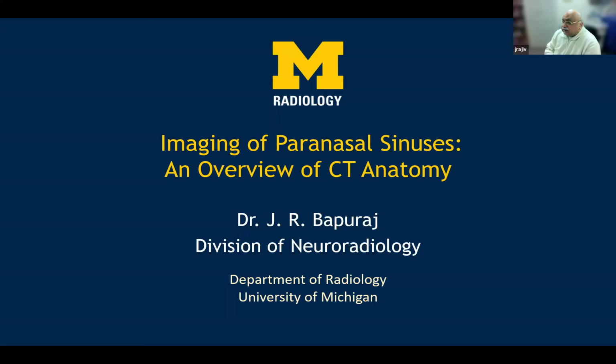So today we'll jump right into imaging of the paranasal sinuses, and we are going to stress upon the overview of the CT anatomy and touch base with various nuanced approaches to looking at the anatomy of the paranasal sinuses, so as to get an informed decision about the surgical aspect of imaging of these structures, especially in light of functional endoscopic sinus surgery.